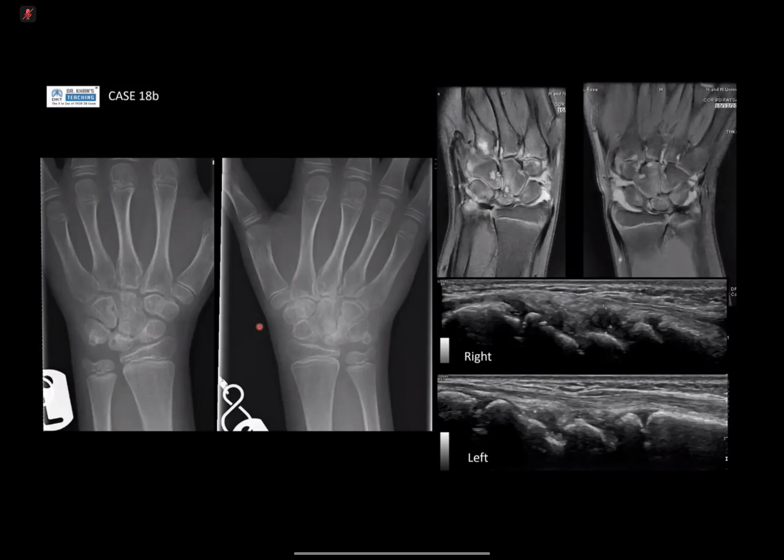On the left and on the right, you can see there is a widening of the scapholunate. You've got the subluxation of the capitate, all looking a lot like what you think in rheumatoid arthritis if it was in an adult. Similarly, the changes on MR show bilateral joint effusion. All these little cystic-like appearances could be subchondral cysts, could represent erosions more than subchondral cysts. Probably likely erosion given the extent of disease.